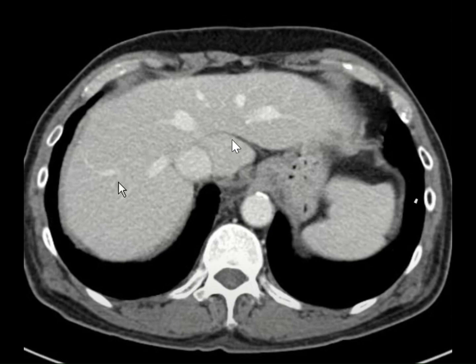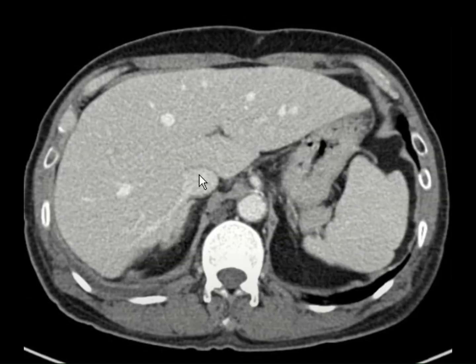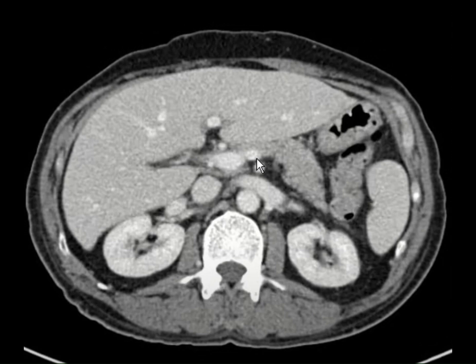And if you go down, 1, 2, 4A, 8, 7. Again, 1, 2, 4A, 8, 7. This is the level of the pancreas, kidneys, lower. These are the lower hepatic segments. I will start with 3, 4B, 5, and 6.